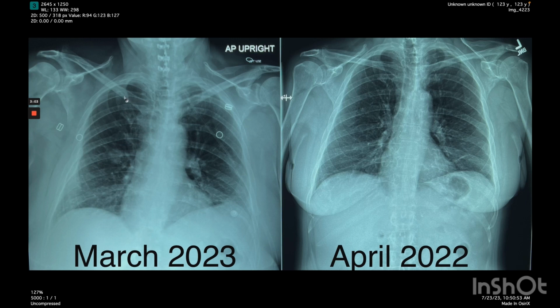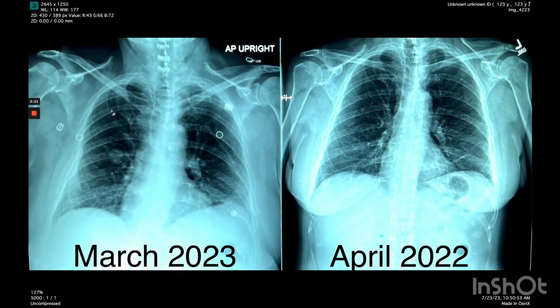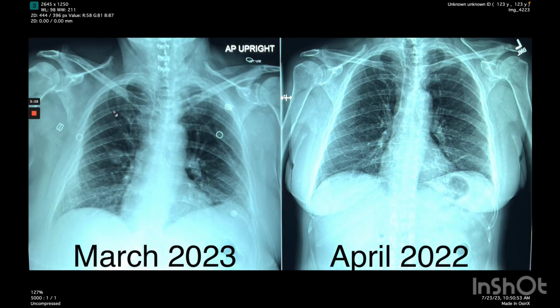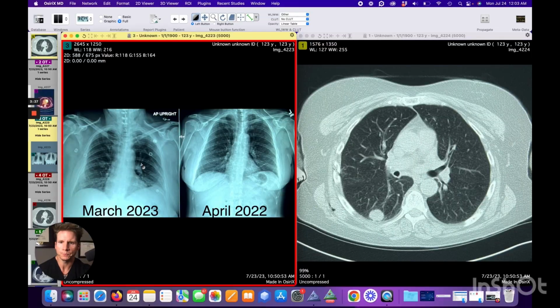I saw a few comments that people were talking about possible pneumothorax. Again, with a pneumothorax, you're going to see a thin white line and absent pleural markings beyond that line to the periphery of the chest, which is really not present here. Sometimes it can be a little bit difficult looking on your computer screen without the benefit of a PACS to window and level. But there was no pneumothorax here. So really the only finding of interest here is the pulmonary nodule. So let's take a look.